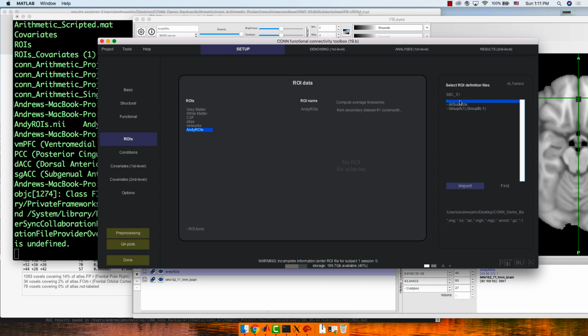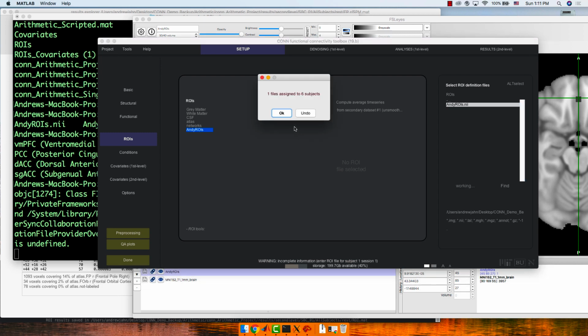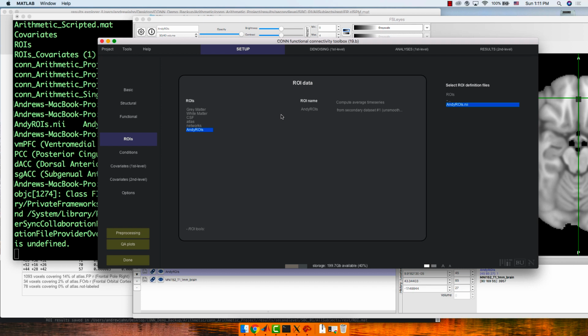Yeah, this ROIs file. Simply click that one, and it will load. Now it's pretty sparse coverage, so I'll need to click this up and down arrow to just see those dots, and just trust me, they're not overlaid on a template here, but they do match up in MNI space where they should be.